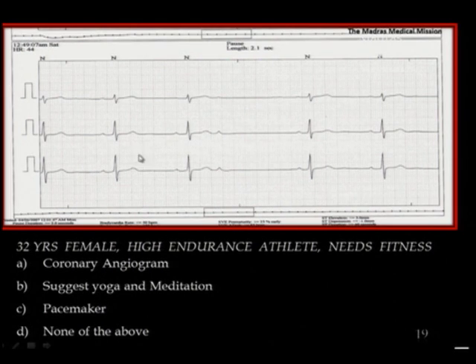in the form of a sinus bradycardia with a prolonged PR, which are seen very, very often in patients who are high endurance athletes because they have high vagal tone. The apparent pause indeed is a concern, but when we look at the reason for this pause, you make this P wave the culprit. This came earlier than expected. So this is a premature atrial contraction that did not conduct because her node is vagally very well toned. So this ECG is not a cause for concern.